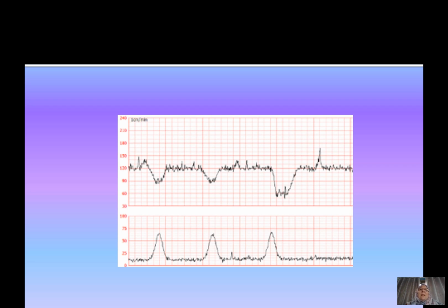Now, have a look at this trace and take a short while to just interpret it for yourself. Starting with the contractions, this patient has 2 to 3, or let's say 2 contractions per 10 minutes. But these contractions do not appear to be regular, because then she has a longer period without contractions. This would need to be assessed on a longer trace and in the clinical context.